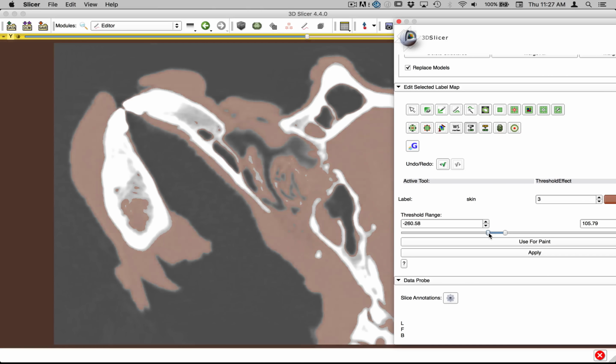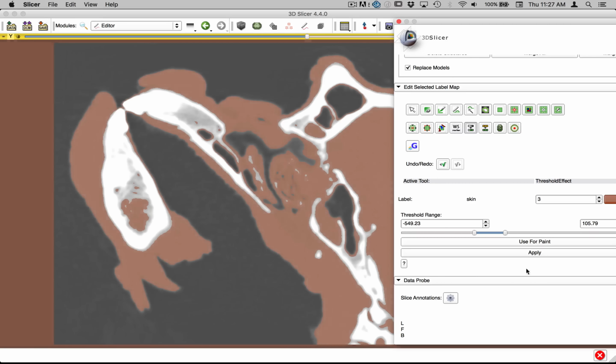And it's not worth it to me to go through and try and paint this out, since we're using the image of the soft tissue just as a backer for the skull images. So I'm just going to scroll through here.